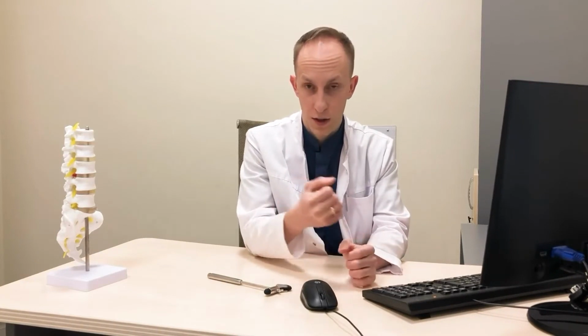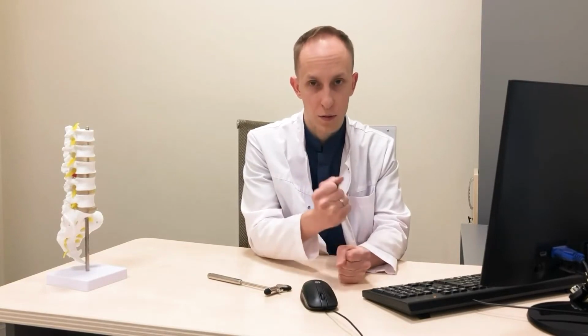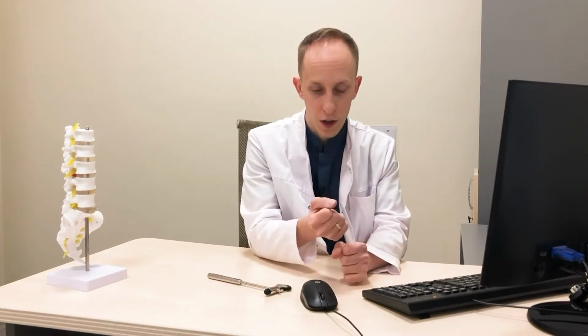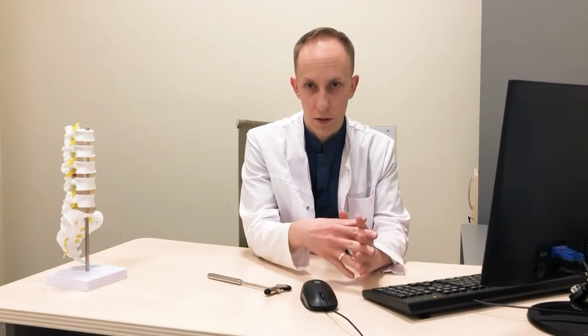According to their signaling characteristics, these are the soft sequesters that have formed in him, with a probability of more than 90% capable of so-called natural or spontaneous resorption. Therefore, this patient's prognosis is extremely favorable. All he needs to do is walk around for now, take medications, limit the load on bending, lifting weights, some sharp twisting. In general, there is no need to loosen up the lower back. Some physiotherapy procedures have no clear proven effect and, in general, are not shown to him now.